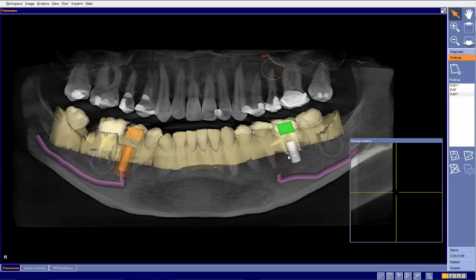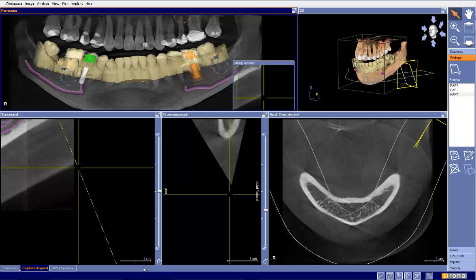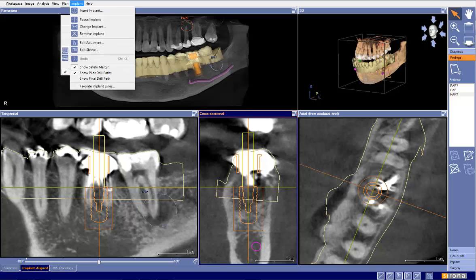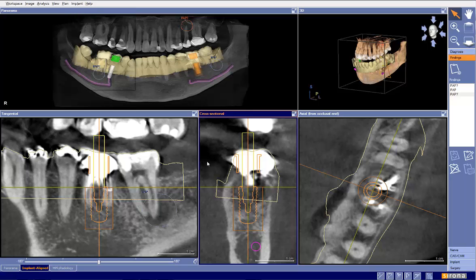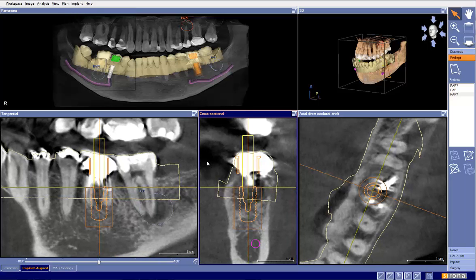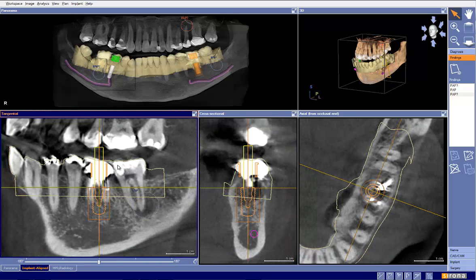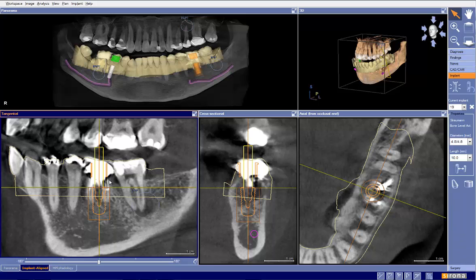So now let's take a look and let's evaluate tooth number 19 first. So for my evaluations, I always go to the implant align view. Here we have number 19, and what I went ahead and done is duplicated the plan so we can compare the plans. And my first assessment is this plan is pretty well done in terms of diagnostically having it in the right place, having it apically extended enough, although that's questionable whether we have enough extension in this particular case to gain stability and go from there.